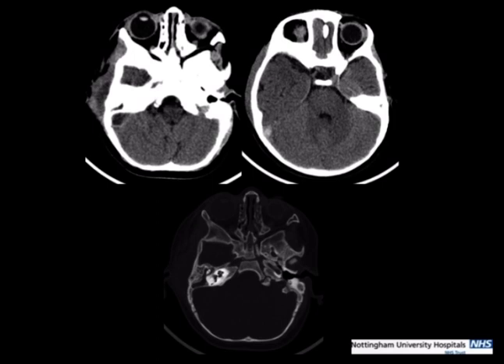This is another infection coming from outside the head in children, fairly common. The reason I wanted to show it to you is because there's a distinction to be made based on the imaging appearances. So this is a 21-month-old with a 1-week history of pyrexia and a swelling over the right mastoid process. You can see this is an unenhanced scan.